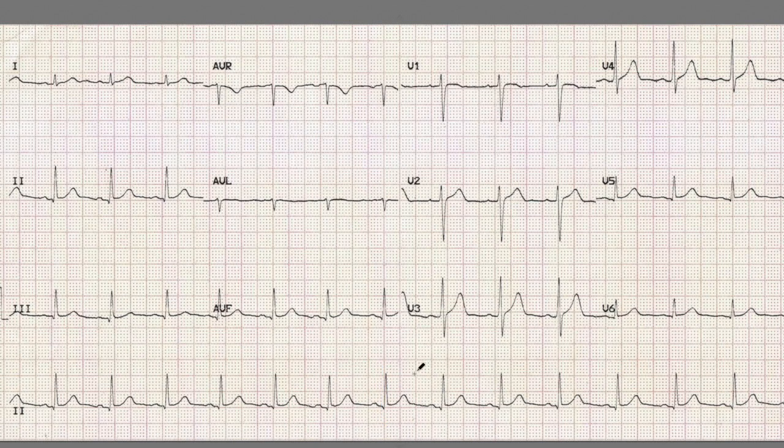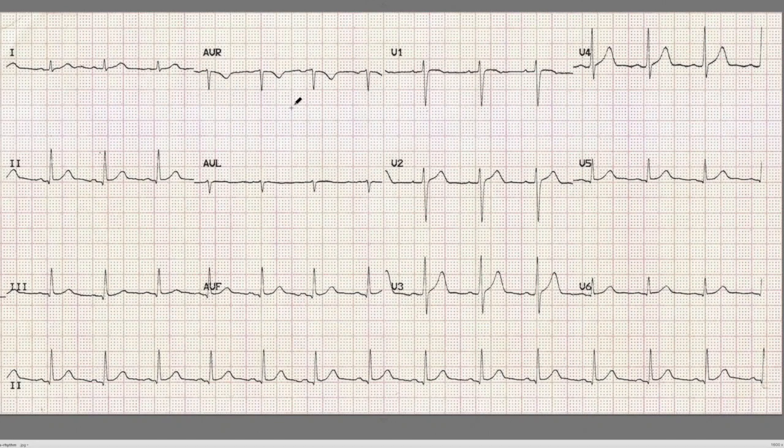The next part we do is axis, which is a little bit more difficult, and sometimes the clinical utility, the clinical yield from this statistic isn't very apparent at first glance. Now remember the triangle that I talked about in the episode before. If you haven't seen the episode before, just look it up on Google Images or something. That becomes important over here.